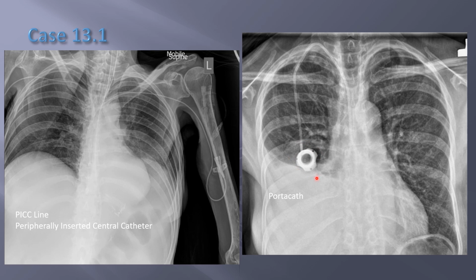If it's a new catheter, they like you to kind of stay away from it, and then I'll have to put a new one in, and you'll have another catheter coming down next to this one. But if it's kind of a mature catheter, we can use it. There's just a technique to do it. There's a sterile technique to cannulate that. But it also looks like this patient might have a pleural effusion here.